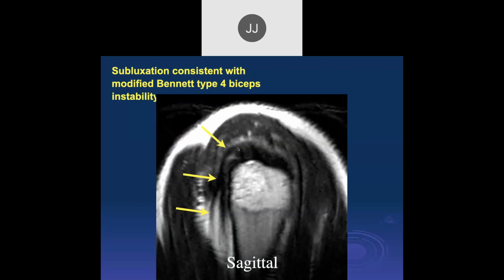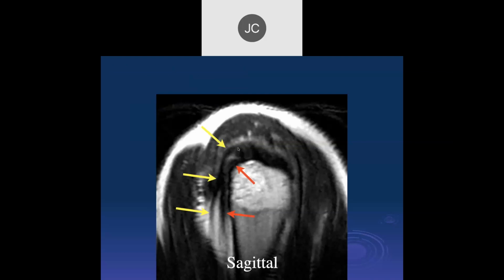Yeah, but it's congenital, John, because if it's a longitudinal tear, then you won't see the vincula on both segments. If it's congenital, then you'll see the vincula on both segments. So both of them had vinculas here, so this was a congenital biceps, pretty rare. And here it just shows the anterior one is subluxed.